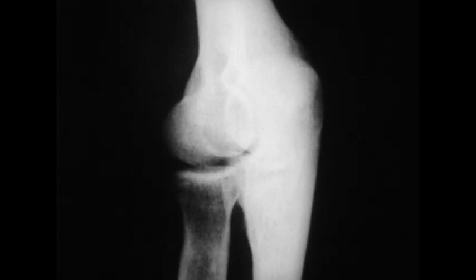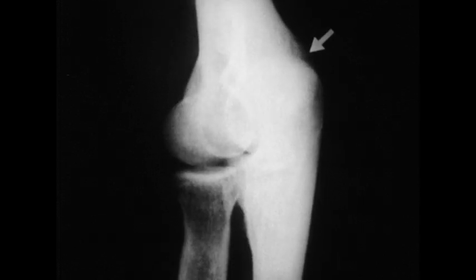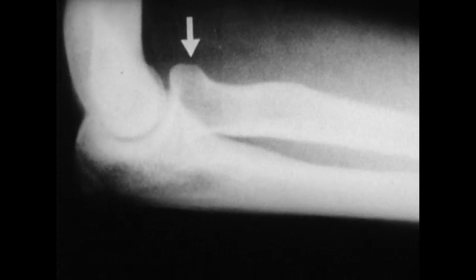There are two articulations, the humeral-ulnar and the humeral-radial. The bones involved are the distal end of the humerus and the proximal portions of the radius and ulna. Flexion and extension are limited respectively by the coronoid process and the olecranon process in their corresponding fossae of the humerus. In flexion and extension, the depression of the disc-like head of the radius glides upon the capitellum. The medial margin of the head of the radius moves in a groove between the capitellum and the trochlea.